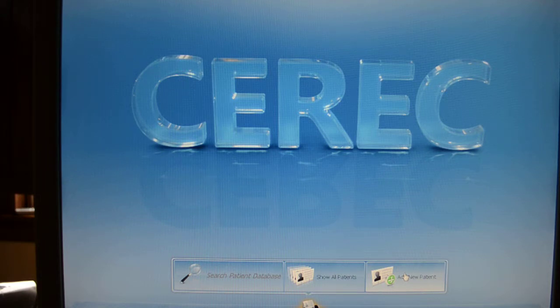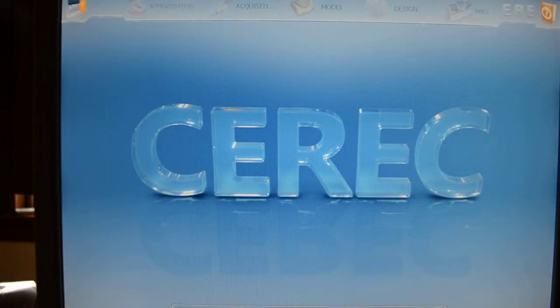Also on this home screen, which will become more evident to you later on as we get into how the technology works, if you come up to the top left, single click, you'll bring up the rest of the menu. And again, as in any Windows program, it highlights programs that you have access to, and everything that you see that is shadowed is turned off, so you can't mess anything up, which is great for guys like me.